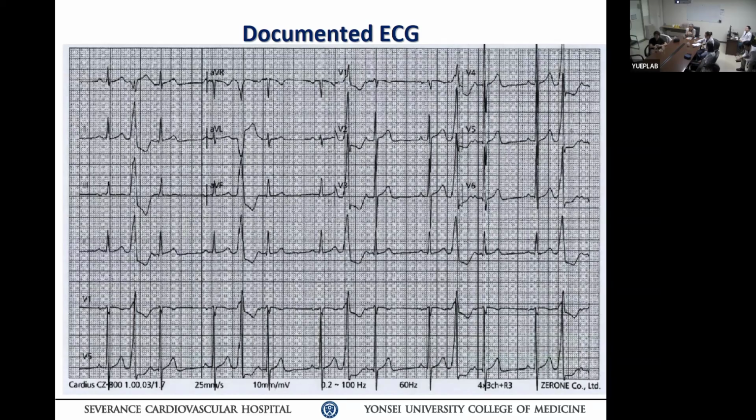Okay, while we are discussing this, if you decide to ablate this, then you need to start thinking how you're going to map this, right? That relates to your practice every day. I have to map what? Cardiac vein, right? For sinus, you have to map endocardium. Decide whether you're going to need epicardial mapping or not, depending on timing, right? So those things come to your mind here.